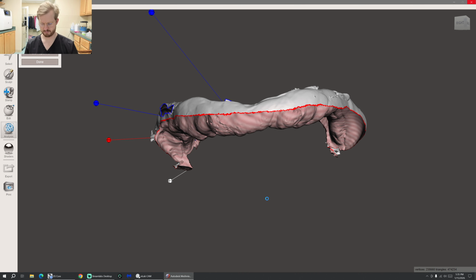Thinking. See the little spinny blue wheel circling means it's thinking. One of the hardest parts with me and computers is just being patient.